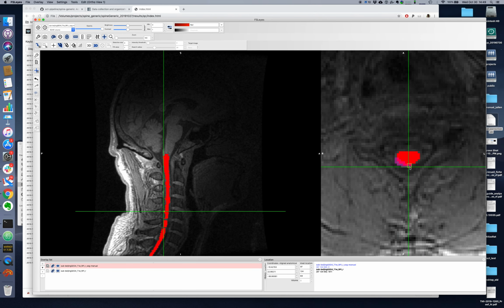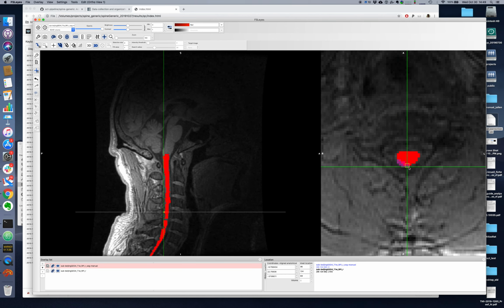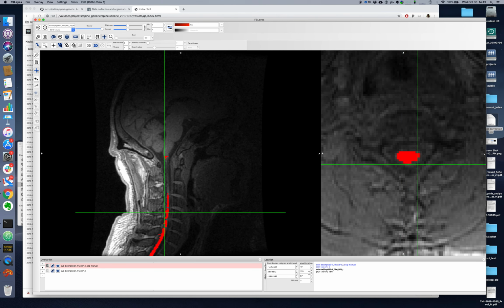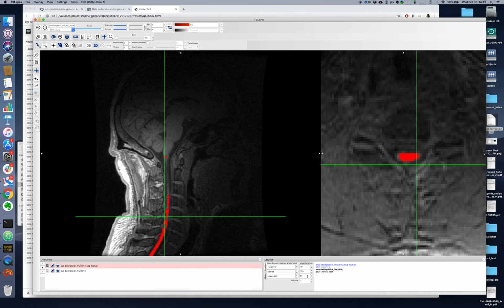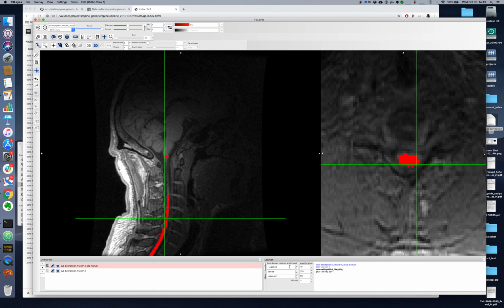Again here. So now we are kind of out of the levels C2, C3, so we don't really care in terms of quantification. But if you want to do a proper job in generating ground truth segmentation, then it would be nice to correct those.